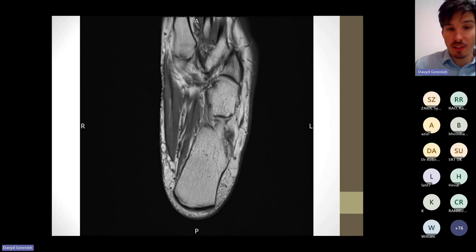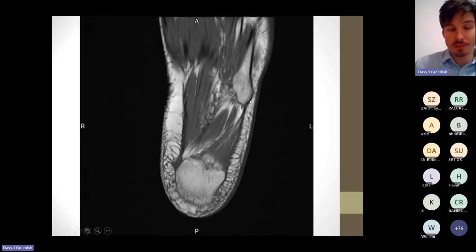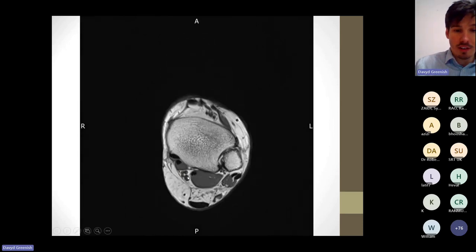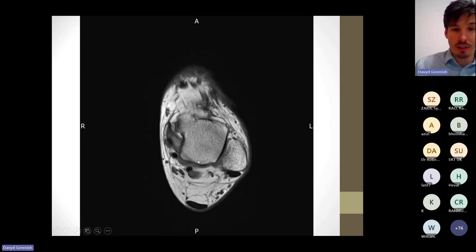Yeah, spot on. Base of fifth. And so if we follow that tendon here, it's going to attach onto the base of fifth. Spot on. And your medial structures here are your Tom, Dick, and very nervous Harry. And just bear in mind that this is the tendon and this is the muscle of your flexor hallucis longus. So really, yeah, spot on, guys.